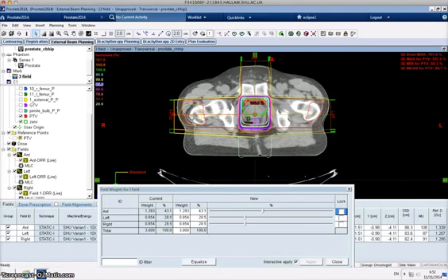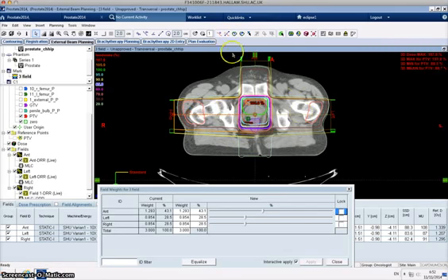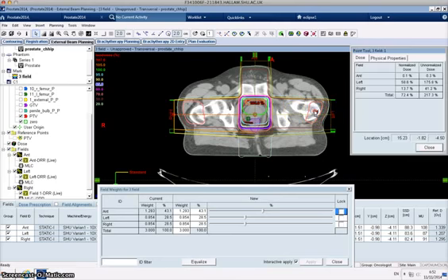The other thing we can do is, if we look at the laterals now, we can see on this side there's 76, and on this side there's only 72, so there's a bit more still going through this side here, and you can see that by the size of this salmon colour. So again, have a think about what we might adjust there to balance those out.